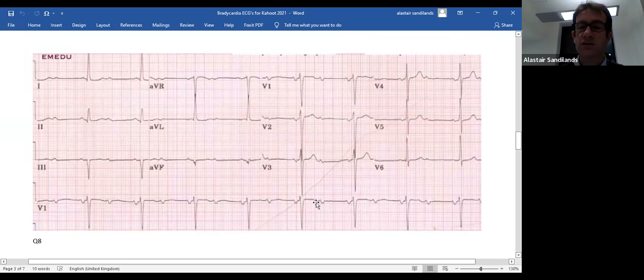So going along here, the P wave fires, the sinus node fires, the AV node's not good, can't take it, recovers. The P wave goes to the QRS, fires, resets itself, the AV node can't fire, the P wave fires, nothing happens, and then a P wave happens, conduction to the ventricle. Again, there's a very fixed pattern, 2 to 1 fixed block. Okay, 2 to 1 AV block.